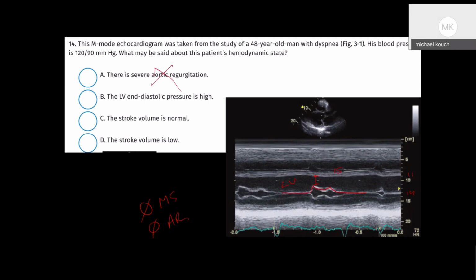Okay. Our LV-EDP is high. Do you see anything to prove to you that your LV-EDP is high? What finding did we look at before? That would be a more gradual descent, right? Well, that would be your mitral stenosis, yeah. But there was a finding that we talked about that looked for increased LV-EDP. B bump or AC shoulder. Yeah, there you go, B bump. Do you see a B bump? No, I don't really see one, right? So that can help take that away.